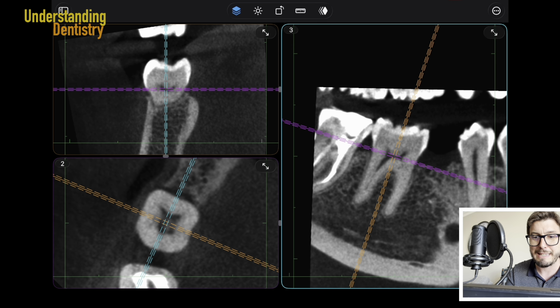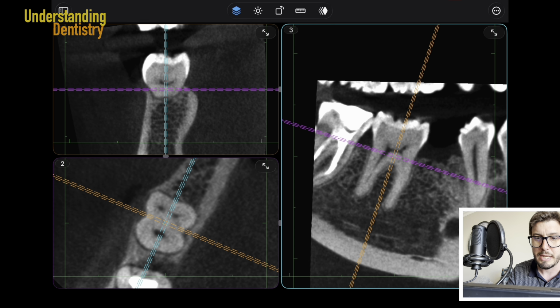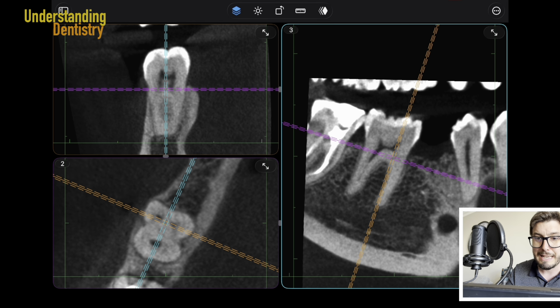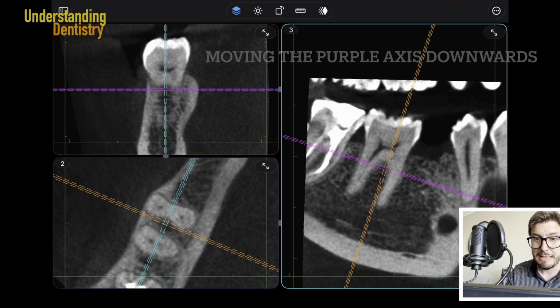We have the axial image here. They will split, and now I have both root canals, the mesial root canals, okay? And of course the distal one, which is the larger one. So a total of 3 root canals. Okay, so I can even see here on the cross-sectional image the 2 entrances of both root canals. That's nice. I will move downwards now, and I can see that they have this length.